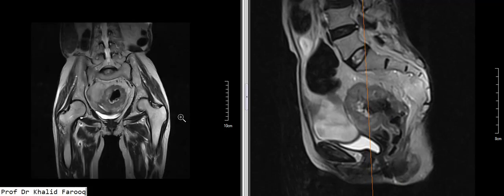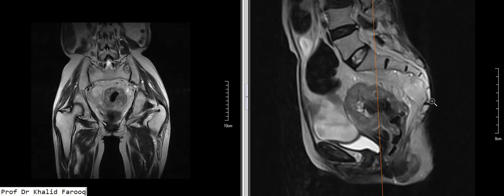So to summarize, this is an example of carcinoma of the rectum. How many modalities can be used for its assessment? Primarily, we can use barium enema, and the second modality, which is very good, is CT scan, having both oral and rectal contrast for the assessment of extent of disease, that is, assessment of the staging process. For this we will include abdomen and pelvis. Third modality is MRI.